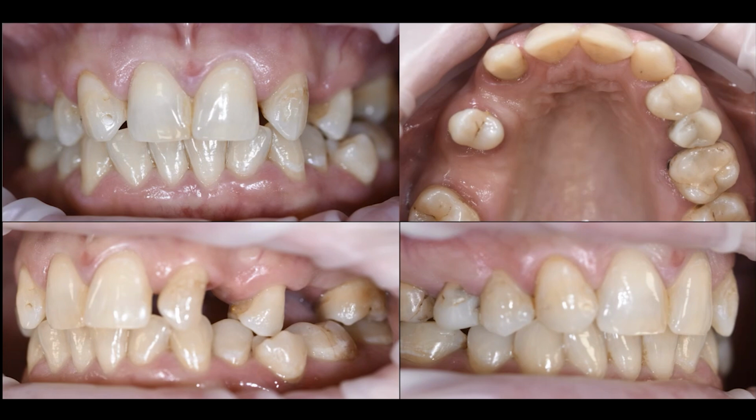Due to the generally good condition of the teeth, it was crucial for me to use minimally invasive grinding. However, the large size of the canines, which we needed to reshape into lateral incisors, naturally leads to greater preparation. It was the first case where we utilized the facial scanner to plan the extent of tooth preparation.